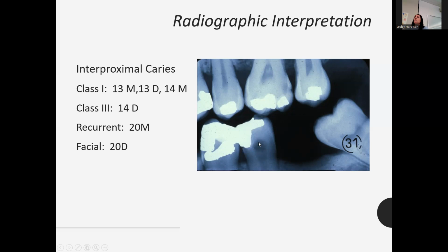And so that's where you get the facial decay from. So there's less structure there. So it makes this like circular part of the pulp look even more translucent or radiolucent. That'd be like a class 5. Yeah, I guess it would be. If it's facial, I guess we think cervical for class 5. And so facial technically might be a little higher up more in the middle of the tooth.